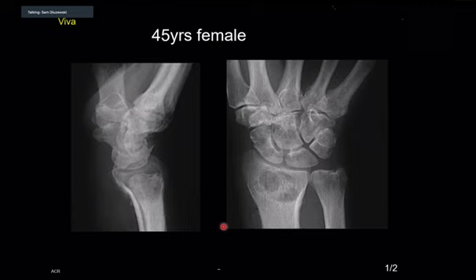I've got a frontal and lateral radiograph in a 45-year-old female, and I can see a lucency projected over the distal radius, which has a well-defined margin. On the lateral, however, I can see a periosteal reaction, the appearance of which is like a sunburst periosteal reaction. I cannot see any fracture or dislocation, and the carpal bones appear unremarkable.